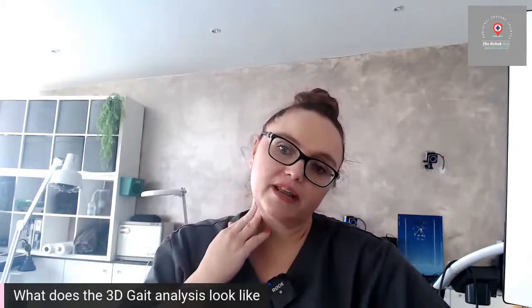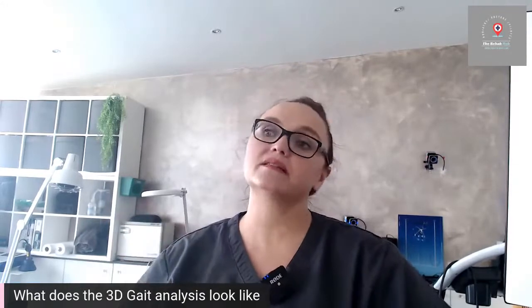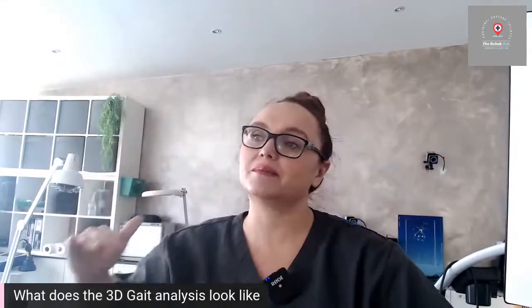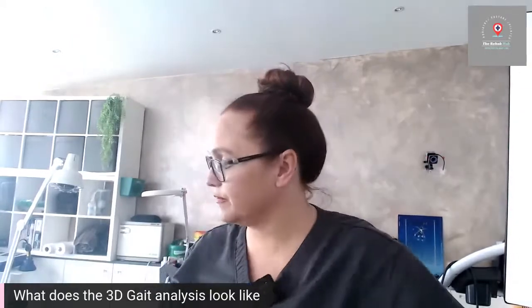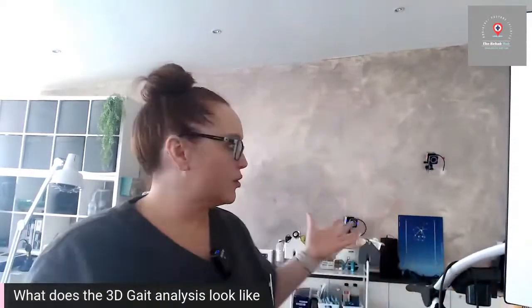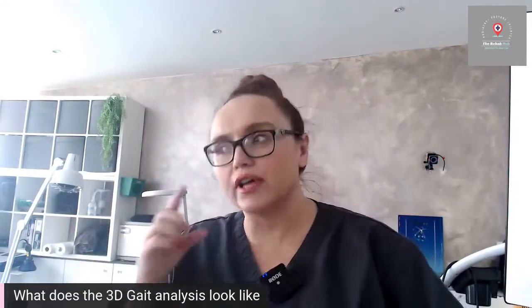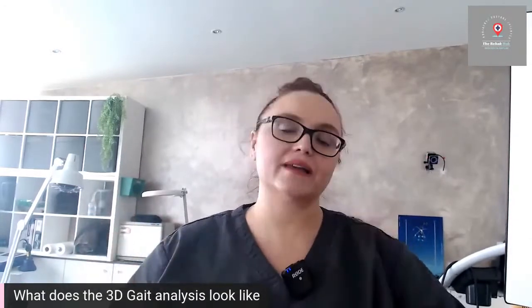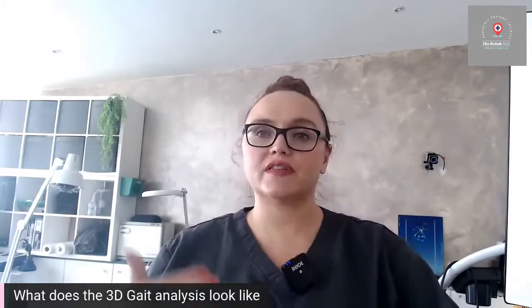The difficulty with those kinds of things is that they're not accurate. You're unable to accurately analyse in 3 planes in that way. You can't look at all those different joints at the same time and analyse in frontal, sagittal and transverse planes. It just isn't possible. There's just no way you can do that. So what our gait analysis system does is it takes something that's subjective, or looks like you're doing that, takes all that guesswork away and actually gives you accurate, this is exactly what your body's doing. And with that, you've then got choices, you've then got power, you know what's going on.